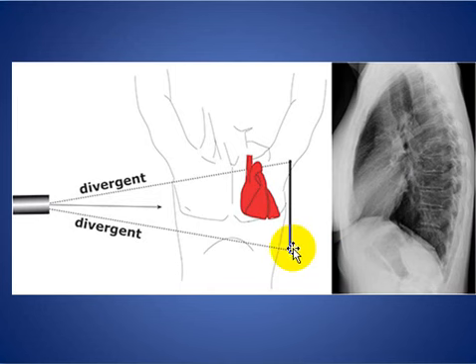As we see here, the patient is on the lateral side, and usually we do the left lateral. Why? Because the heart will be close to the X-ray film, and there is no magnification of the heart, and the X-ray is coming from the right to the left, and the hands are up to prevent overshadowing in that area.